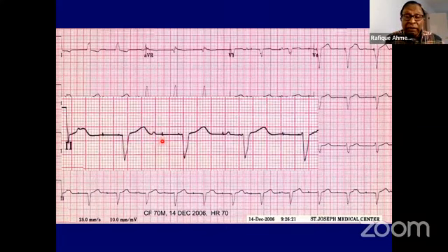Now, this atrial pacing spike, there is no P wave. By this alone, I cannot tell that there is failure to capture because there is a P wave, and if it paces immediately after the P wave, it can be refractory. So this one tells me there is failure to capture the atrium, and this one tells me there is failure to sense the atrium because it should not have paced here. It should have seen this. And if it had sensed it, it would have paced the ventricle synchronized. So it is not seeing the P wave at all.